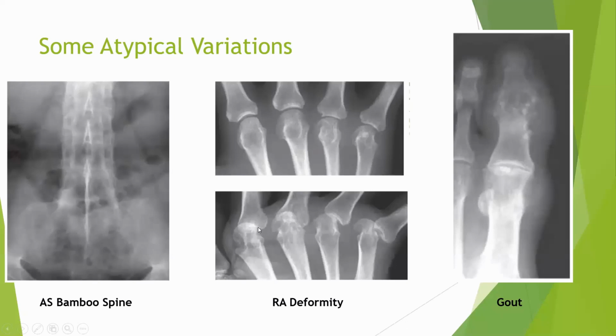Look at the metacarpophalangeal joint. The more medial you go, anatomically, there is not much displacement over here. Here you have subluxation. For the little finger, you have complete dislocation of the metacarpals from the phalanges. So from lateral to medial, first thing is right. Anatomically, the pinky, the little finger, is completely dislocated, from no subluxation to complete dislocation, and a little bit of subluxation over here.